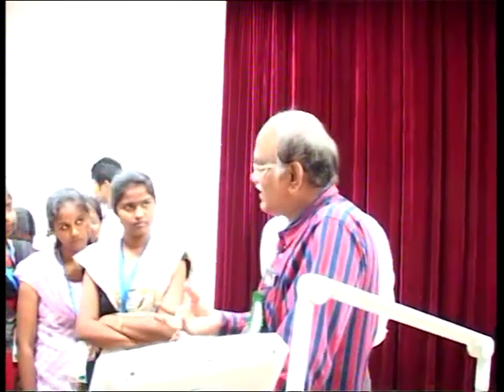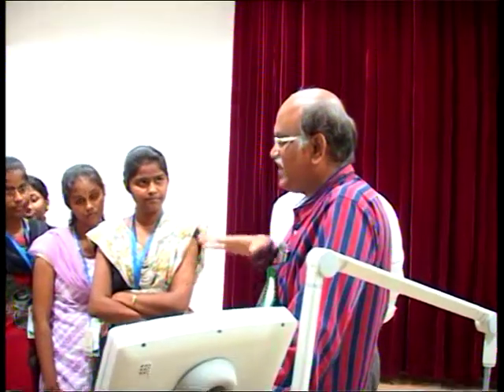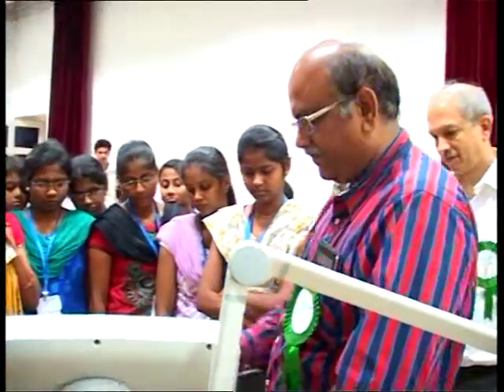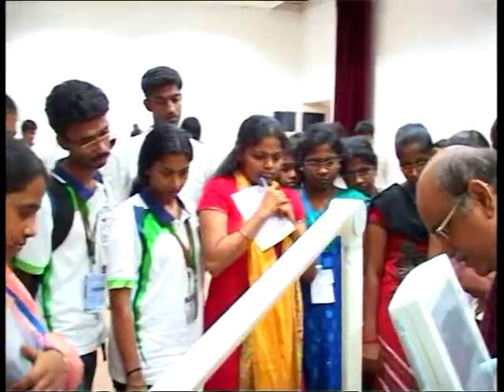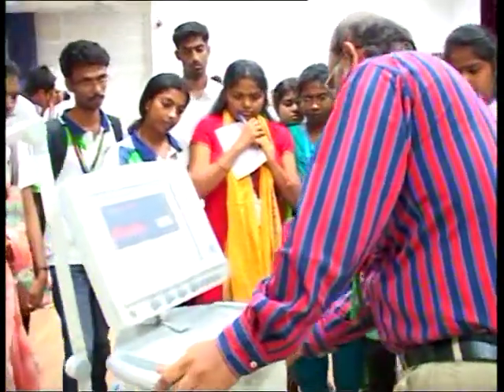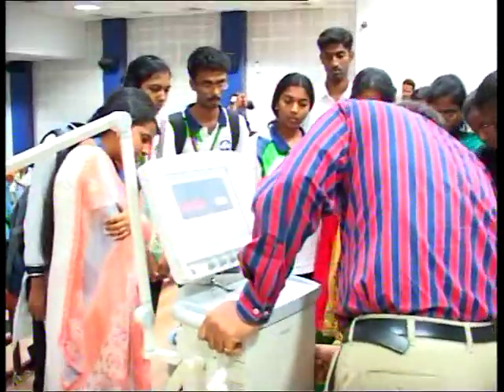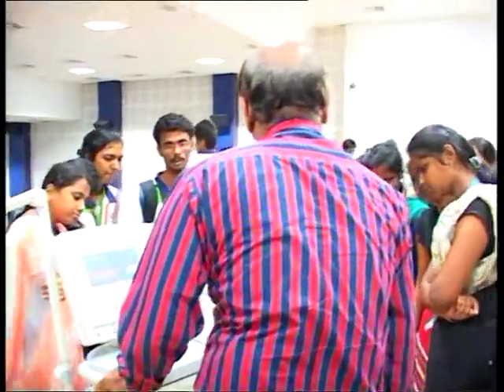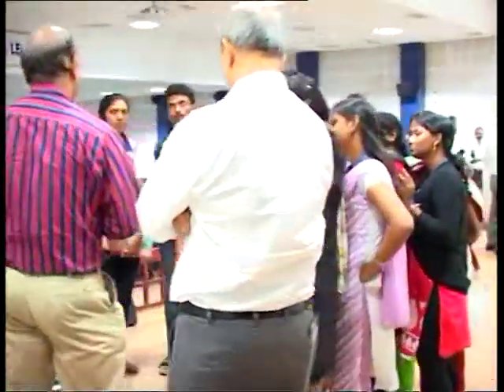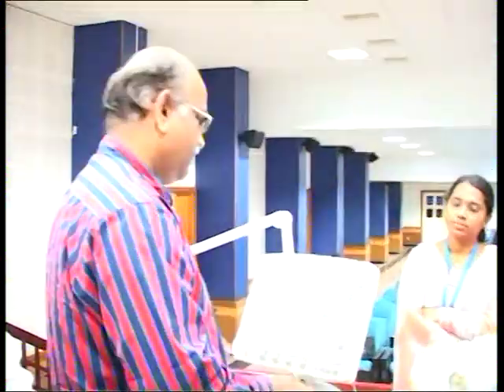So the compressor is the unit which sucks the atmospheric air, pressurizes it, and sends it to the machine. And this air is filtered here because we need to give pure air to the patient. Okay? And it is connected here. You see the module here. Here the air is connected. Here you have to connect the oxygen. Okay? Inside the machine it will mix both air and oxygen, and then deliver exactly the percentage of oxygen that you are setting for the patient.